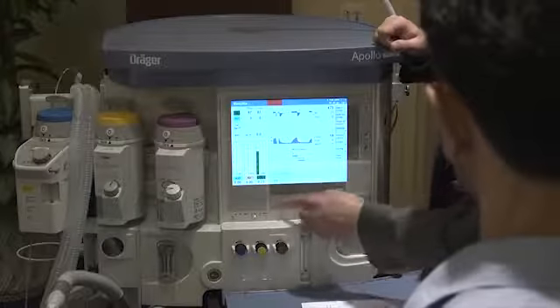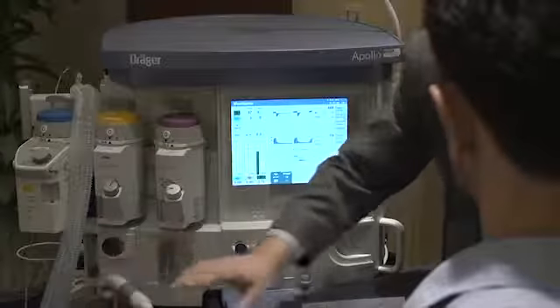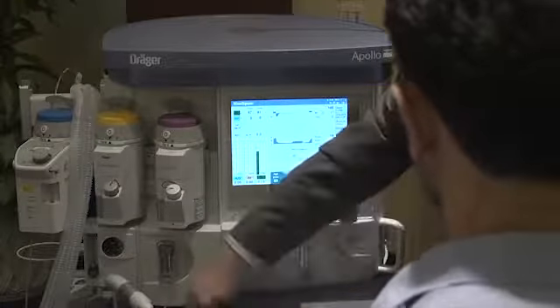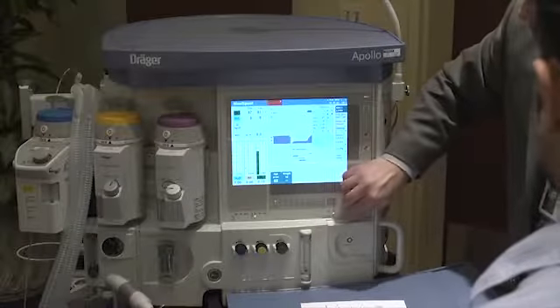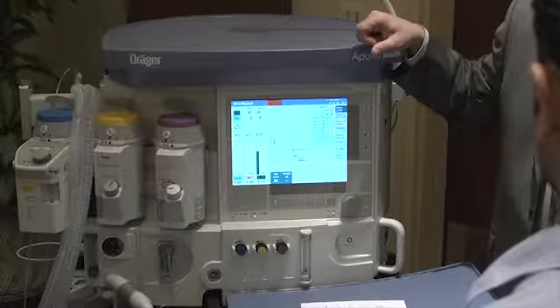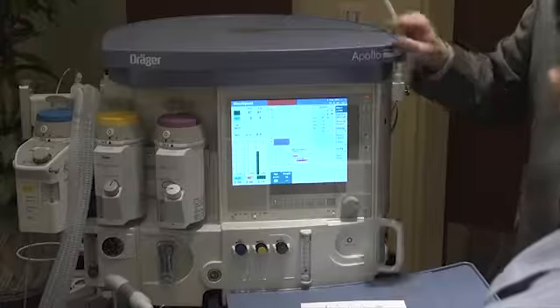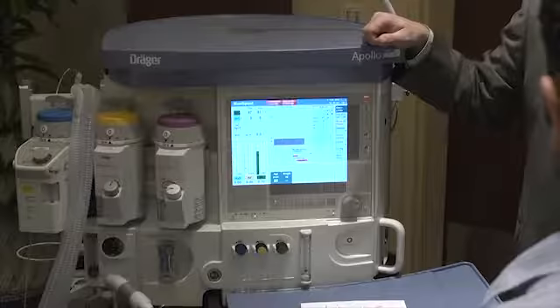Another thing you can get is a continuing airway pressure alarm. That's typically when you've intubated and you've got the APL valve closed, and the system fills up with gas. I want to adjust my alarm down a little bit so you can see what happens. We've built pressure, and now we've stayed above our apnea pressure line, that 8 or whatever you've got it set at, for more than 15 seconds. And then we'll get a continuing pressure alarm, okay? So that's something you want to be very concerned with.